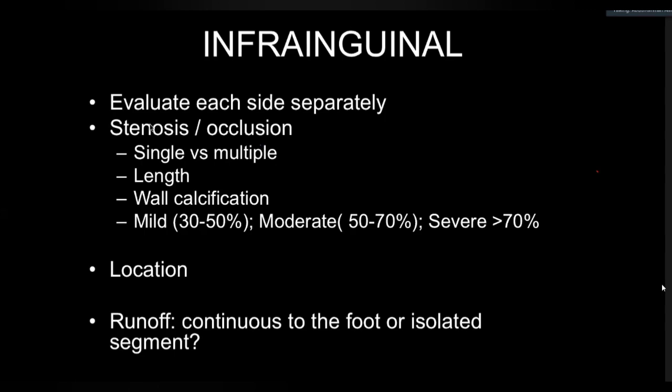So again, the artery is either patent or it's occluded or it has a stenosis. That's all it is. If it's patent, there's contrast in it. If there's no contrast in it, it's occluded. And if there's partial contrast, then it's stenosis. That's all you need to know.